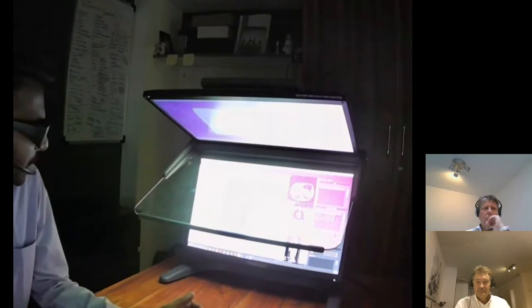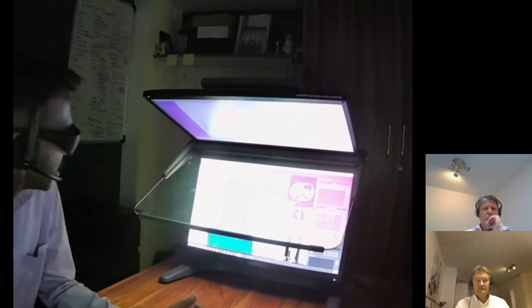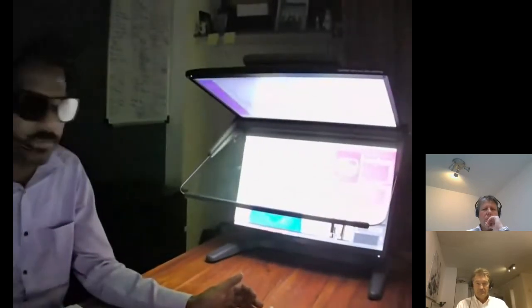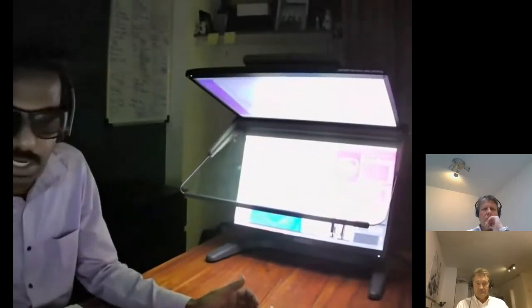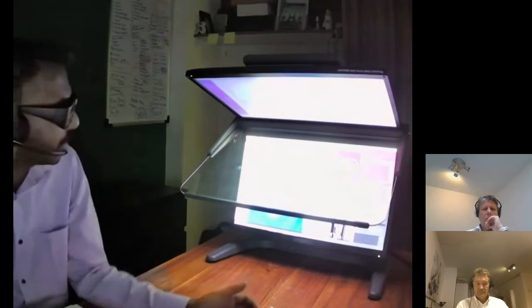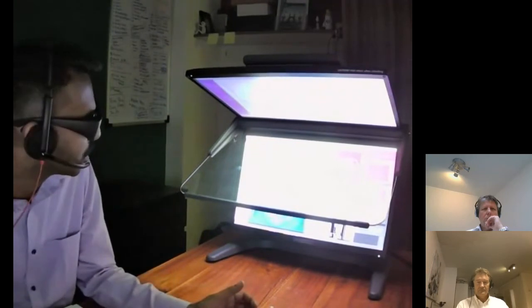So when we actually look at these images over here, it's much more interactive. And I'm also not from the medical field, but when Aryan and Arjun told me about the software, we have trial licenses ready for people to use it.